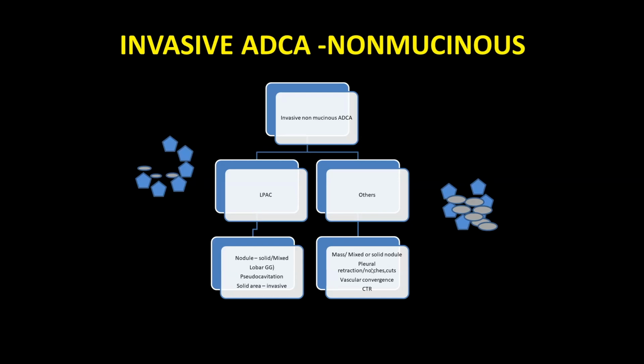Some of the main clues that will tell you this nodule is malignant are, apart from spiculation, coarse septal thickening, and pleural retraction. If it is attached to the pleura, it will retract, and then there are surface notches. Now again, in India, it's a problem. I don't know how many people have studied, but in India, TB can look exactly the same. So keep that in mind. A very common mimic is TB.